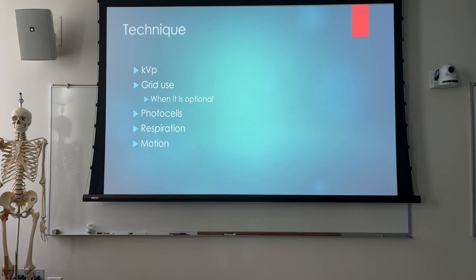KVP. Again, I think that we're going to see an increase in KVP over time because our KVP just doesn't affect our contrast the way it used to. So grid use, remember our rules for grid use, and if the standards in your hospital are to use virtual grid, then that's fine. That's all well and good. I don't think they're as efficient yet as what a physical grid is, but they're better than nothing.